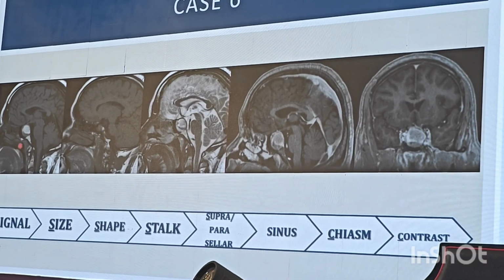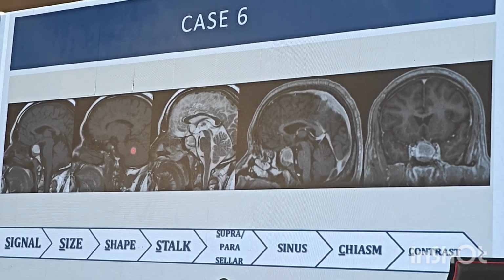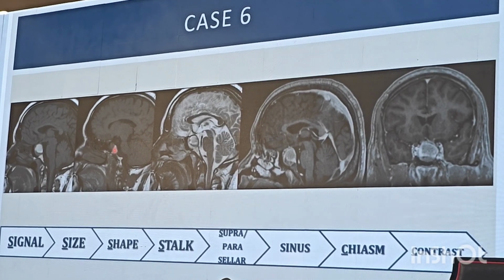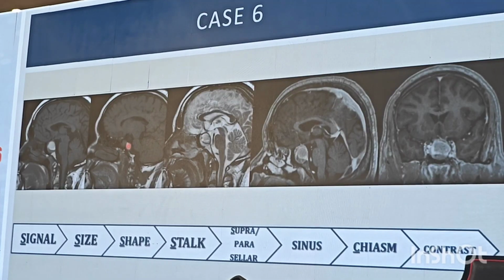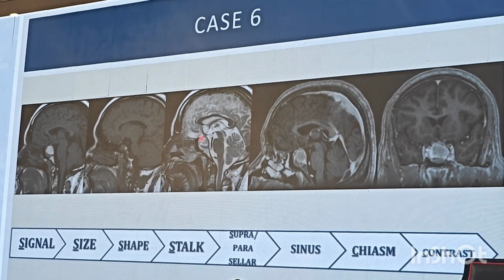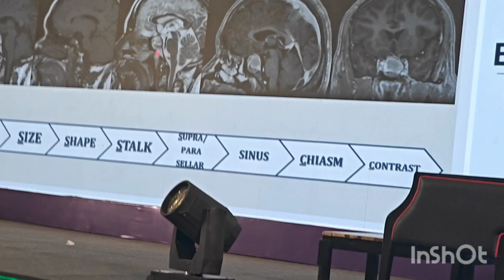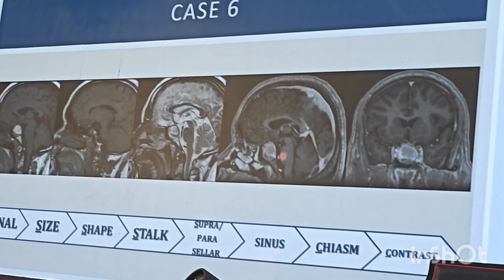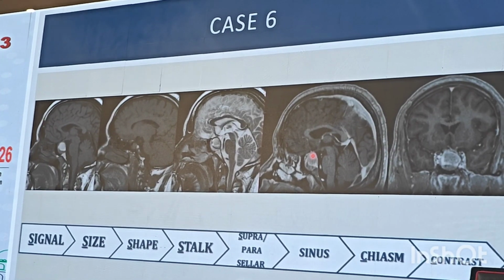Your anterior pituitary looks kind of weird. It has got a bright signal within it. I have kept this other image just to show you that the posterior pituitary is not absent. It is just pushed towards the parasagittal location. Right? On T2, this is having a very grayish appearance. And post contrast, you can't comment on the enhancement of this thing because it is already bright on T1, right?